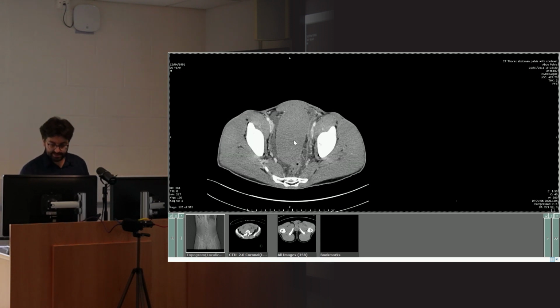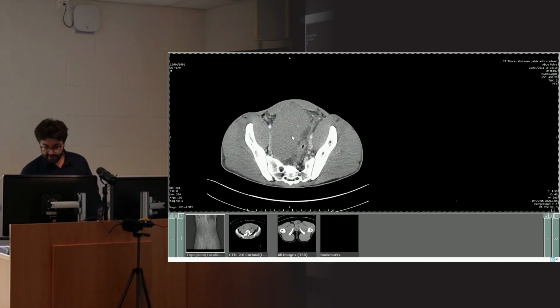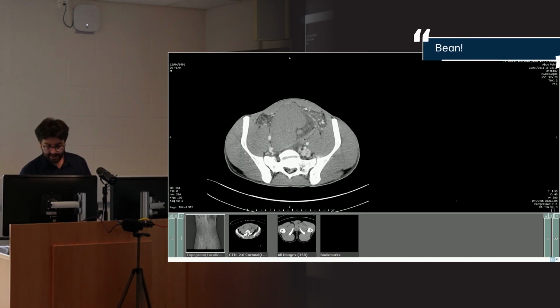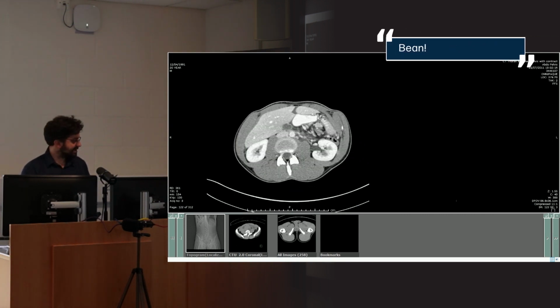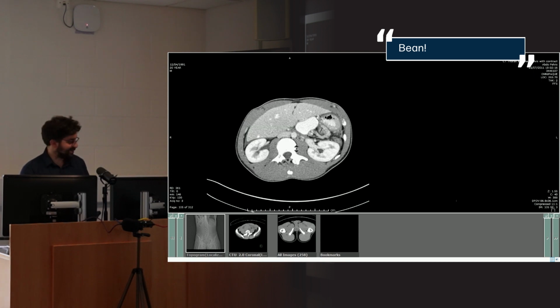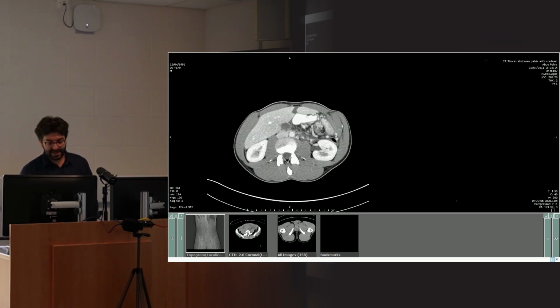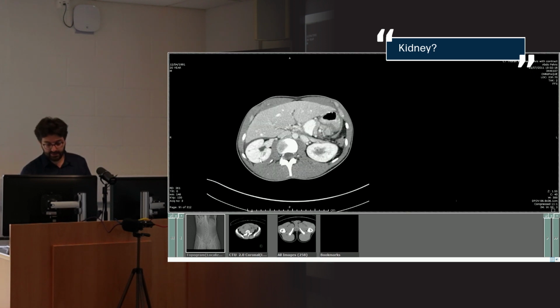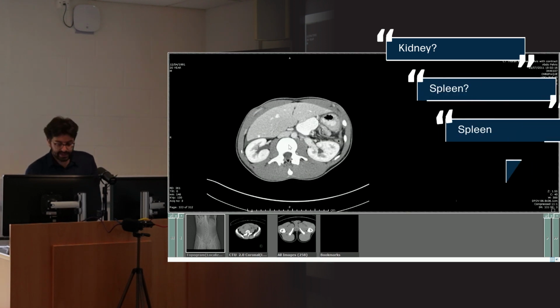What is its shape? I drew its sort of shape for you. What shape is that? It is related, just as a clue. Yeah, it looks a bit like a bean. Yeah, that's right. It's related to an organ that's missing. Because what organ do you normally see in the left upper quadrant? So kidney, yeah, bean shape, but both kidneys are accounted for.